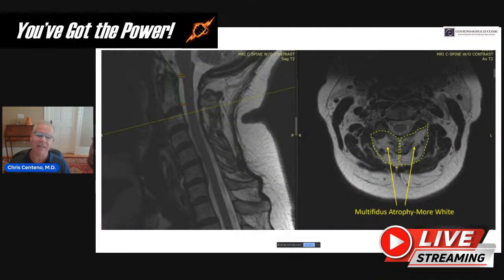Now, we're going to look at the bad steak here, is what I tell my patients. So the bad steak is where we have atrophy. And it's a bad steak because it has a lot of fat. So if we look here into this same compartment, we now see mostly white. So if we're in the grocery store, we're not going to buy this steak. It's almost all fat and very little dark muscle in there, right? You got a little more dark muscle here. You got a little dark muscle there. But if you were in the grocery store, you really wouldn't buy this steak because it's almost all fat. So that's what atrophy looks like, where you're seeing more white.